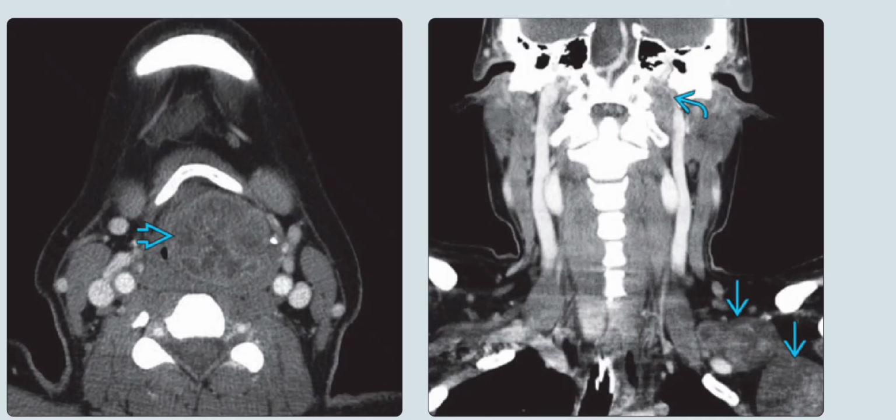Left is the axial contrast-enhanced CT scan of the neck in a 31-year-old woman with schwannomatosis, and it shows a circumscribed, encapsulated, heterogeneously enhancing submucosal mass in the supraglottic larynx, which nearly completely effaces the laryngeal airway. Coronal reconstruction reveals the additional heterogeneous density masses involving the left brachial plexus and jugular foramen, compatible with numerous schwannomas in this patient with schwannomatosis.